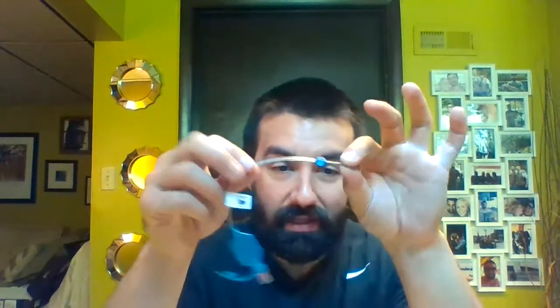Then you have to carefully thread this down into the pilot line, and you hope that it fixes your problem. We'll talk about this in another segment. But once again, if you get a nick in your pilot line, whether it's from teeth, a shaving incident, or whatever, or if your pilot balloon goes bad, you can try to salvage it and swap that out by using this little kit here.